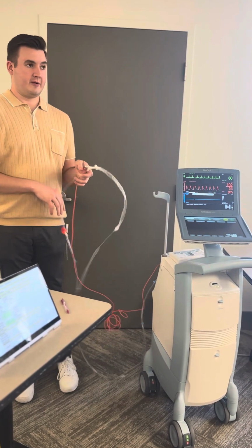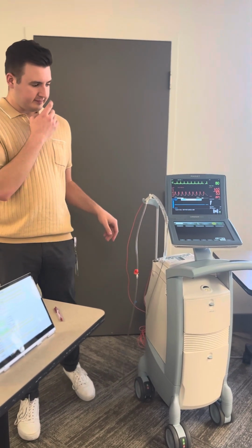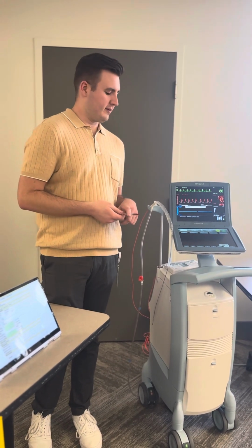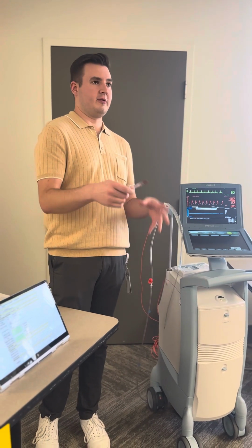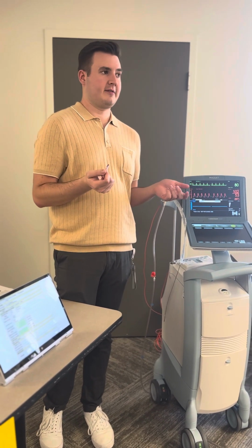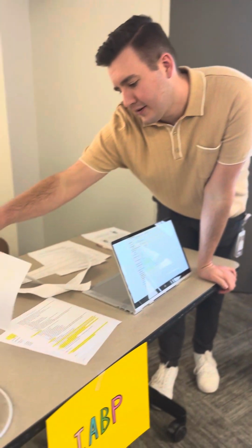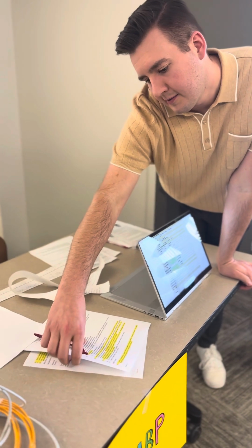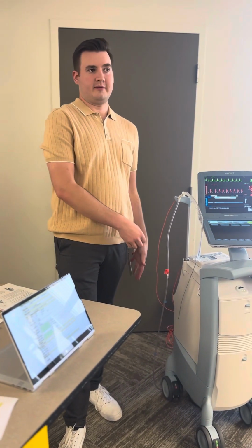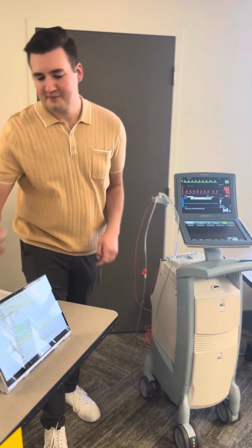So every 24 hours, we're going to order a chest x-ray. We're going to watch their platelet count for bleeding as well. Hourly, we're going to be checking their urine output too, because if this balloon gets dislodged or pulled back, it can occlude the renal arteries, and now you've lost perfusion to your kidneys. Let's see what else we've got here. Oh, you should probably consider immobilizing the extremity wherever it's going in, because if this goes bad, you've got a big problem.